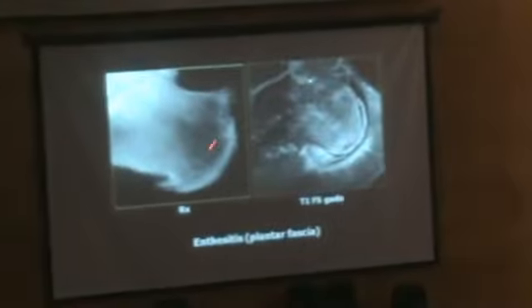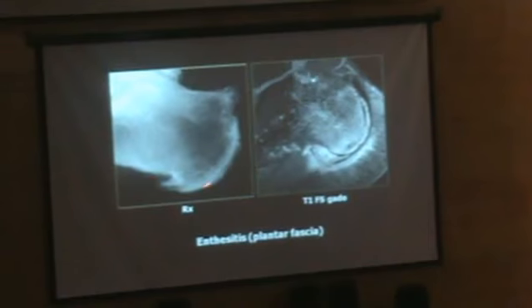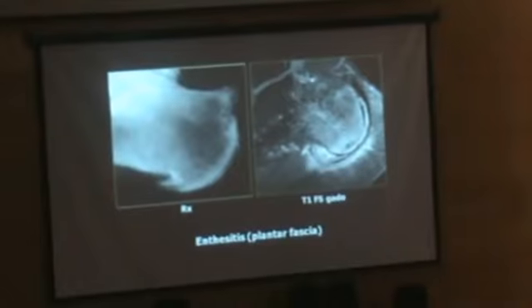What about the appendicular involvement? I will go through quickly for the appendicular. So ankylosing spondylitis can affect the upper and lower limbs, and classically is the calcaneum insertions of the Achilles tendon and the plantar fascia. Of course, on the X-ray we can see a lot of hyperostosis and enthesophytes being produced, but we cannot measure the inflammation.